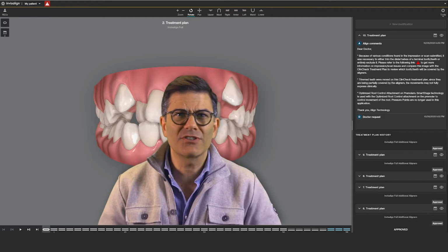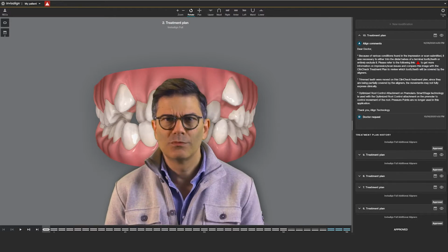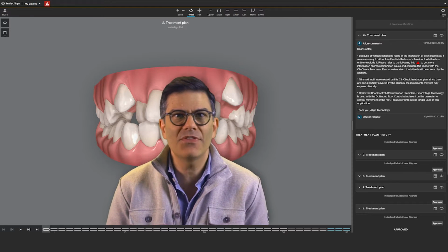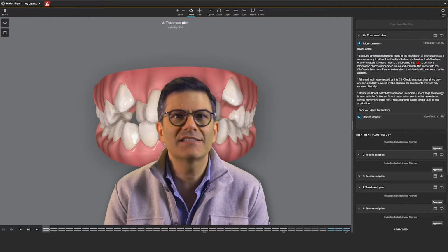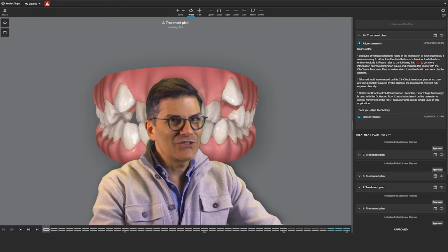With new features, a new look and feel. Align did a great job and finally answered to something we were asking for a long time. Are you ready? Let's start the tour.